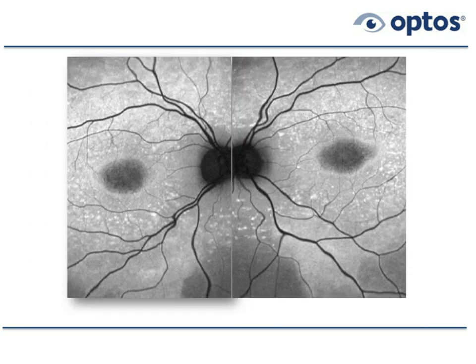Typically in these types of retinal degeneration, Stargardt's and virtually all the retinitis pigmentosas and all the cousins of RP, we get very good symmetry between the right and left eye. Here we can see this beautiful symmetry between the right and left eye, and this helps us make a determination that this is actually an inherited disease. Specifically, the gene here is an ABCA4 abnormality. We know that because we did genetics on this patient. Notice the autofluorescence flecks, but in a few years, some of those may be dark as well.